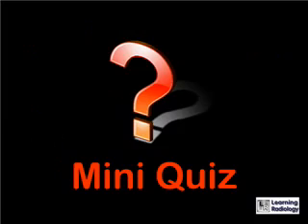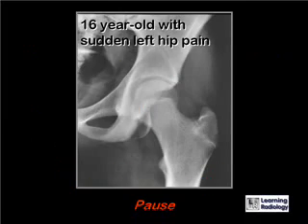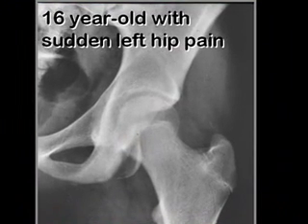Now it's time for your mini quiz. Use the pause button on your computer or MP3 player. This is a 16-year-old with sudden left hip pain. What does the patient have?